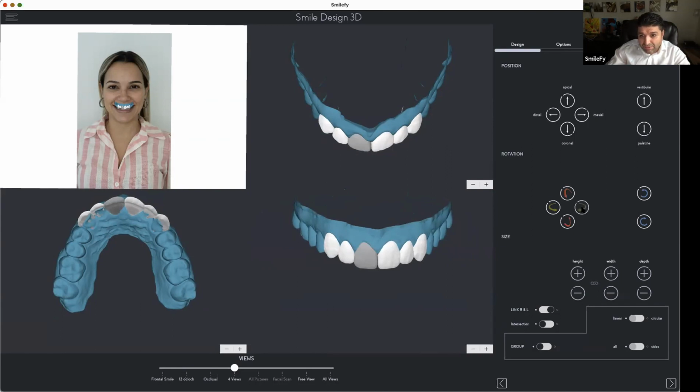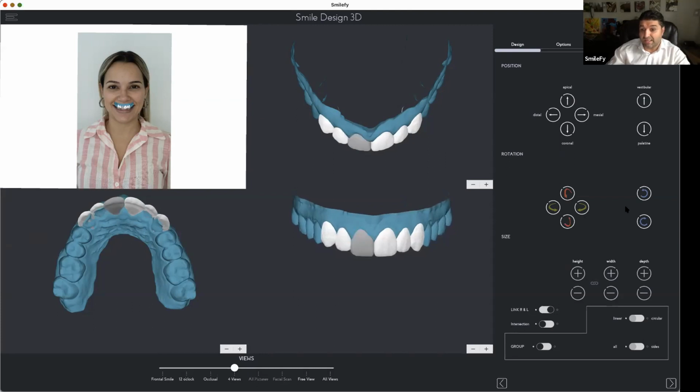Maybe the rotation a little bit better here. Yeah, I like it. Here it's too much. Bring it back. Okay. So here we go. It took me a couple of minutes, really, and I do have design over the prep, right? And I can show.